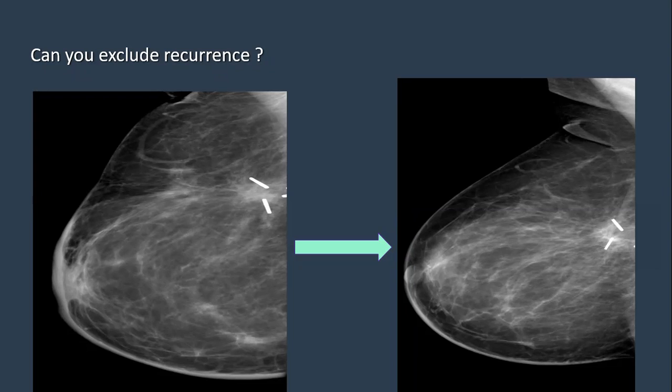There is something pushing that calcification, or it is getting fragmented. So there is something eating, infiltrating. You see? If the calcification is a coarse, large dystrophic type and is getting fragmented, that means there are underlying lesions resulting in fragmentation, and this is an indirect sign of recurrence. You got the point now, okay?